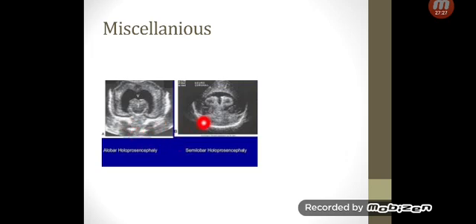So these pictures are showing holoprosencephaly, which can be isolated or part of a syndrome, especially midline syndromes like trisomy 13 or Smith-Lemli-Opitz syndrome.